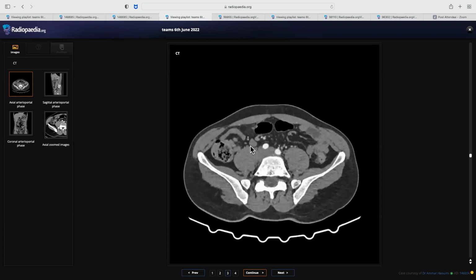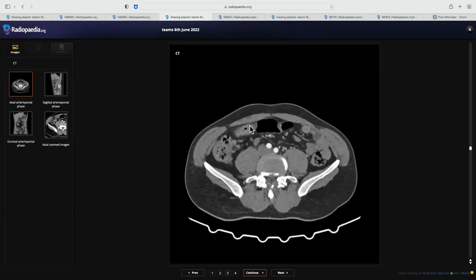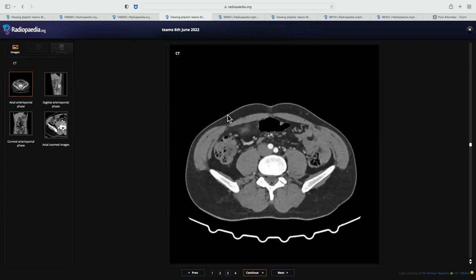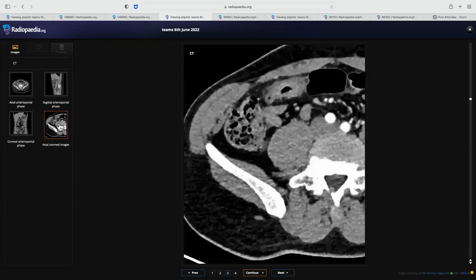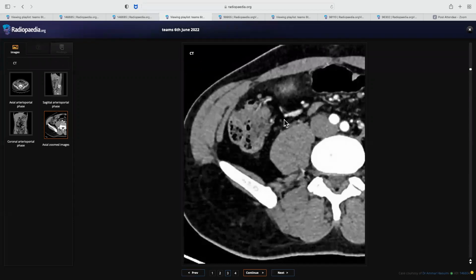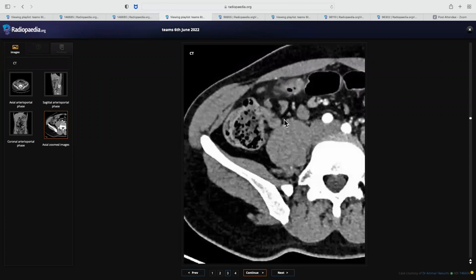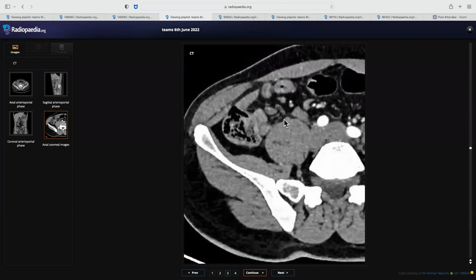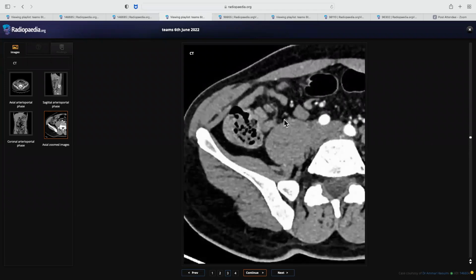Okay, so it's not continuing with the bowel. You can see the rest of the series, maybe that will help you. I'll see a zoomed image. Yes, you can see that, though in exams, they won't give that. Oh yeah, it's not continuing with the bowel and there is a central fat density area within it. So findings are suggestive of epiploic appendagitis.